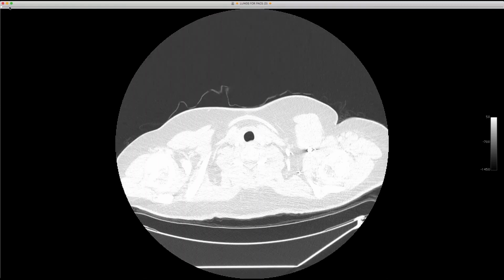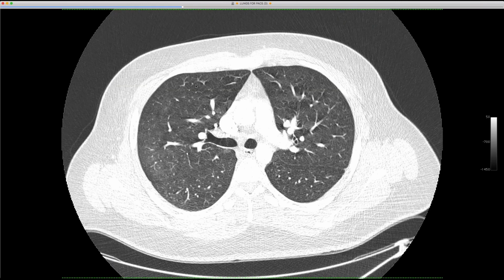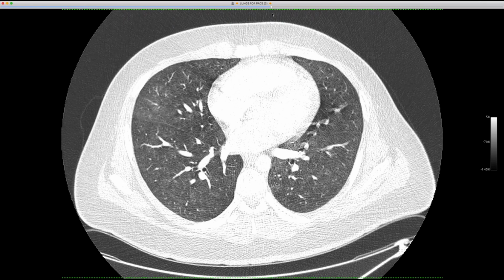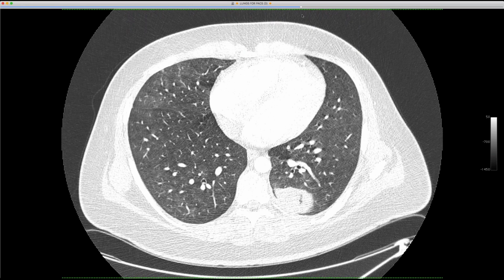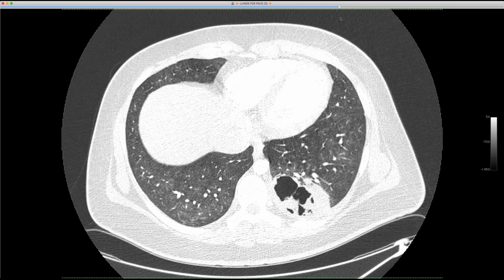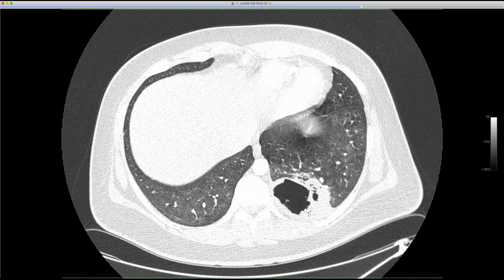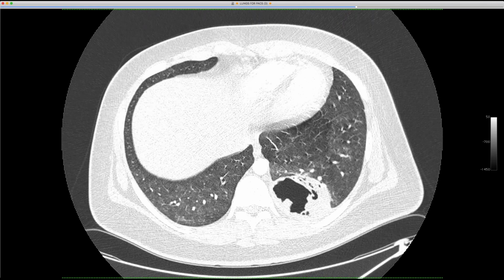So here's the CT scan, which shows two different findings. First, it shows this ground glass opacity, predominantly in that right upper lobe, creeping into the middle lobe as well. Looks very, what's the word I'm looking for? Acinar type. And then here's this ugly, ugly cavity in the left lower lobe, and then sort of this background ground glass. So obviously infection, tumor, but it was a relatively younger patient.